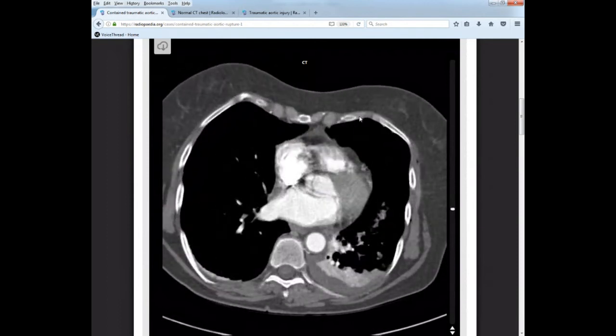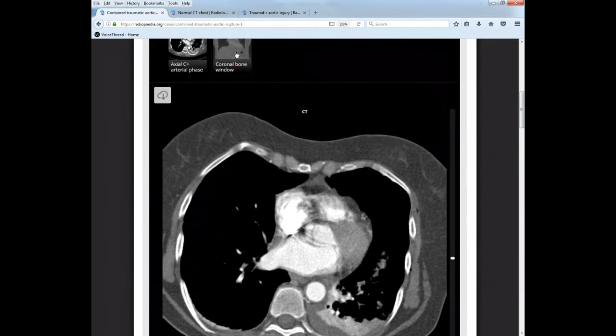And this patient is older. They have some calcification in here, which is normal. You guys should have all seen that on a chest x-ray as well. It's just much more detailed on a CT. So there's that on a traumatic injury.